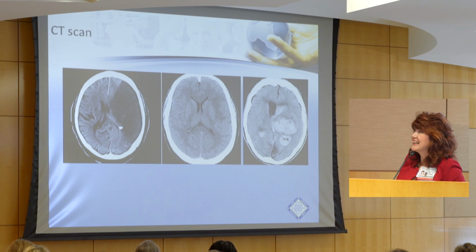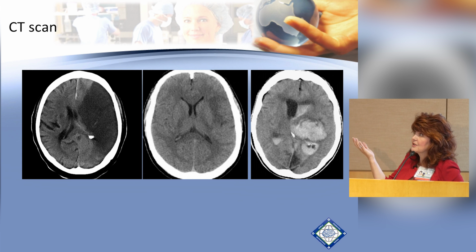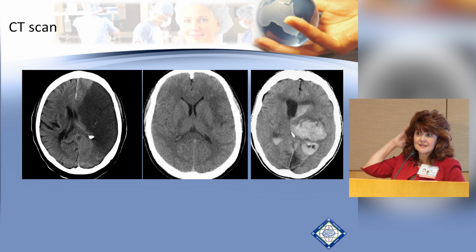That is a ton of bleeding. And so that's time to call someone from our team, the neurosurgery team, just to look at the scan. We're probably not going to do anything about that unless you want an external ventricular catheter put in, because this is deep hemispheric bleeding. They often don't benefit from neurosurgical care. The people that do are the people that have cerebellar hemorrhages or superficial hemorrhages. Those are much more likely to maybe benefit. If this is a really young person, that's a dominant hemisphere, and so even hemicraniectomy is questionable, because are we going to really help them if we end up with someone with a dominant hemisphere, very large hemorrhage?